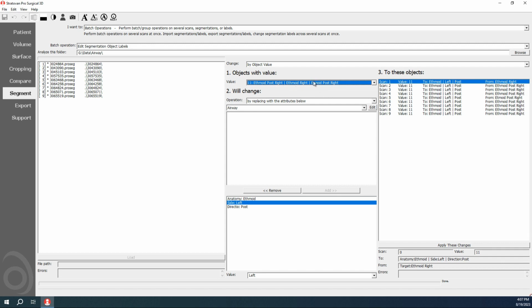There's even a spelling error here. That's one of the advantages of using this attributes database: you can ensure consistent spelling between all of these different objects and operators. So you can see the spelling error here. Let's do the update there.